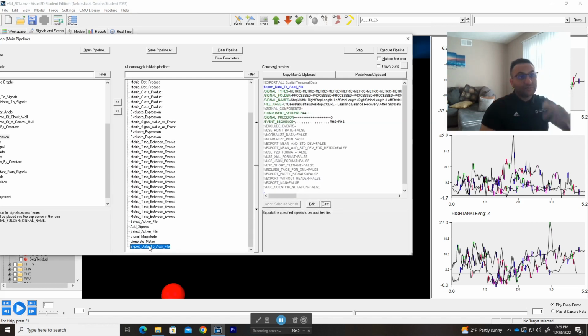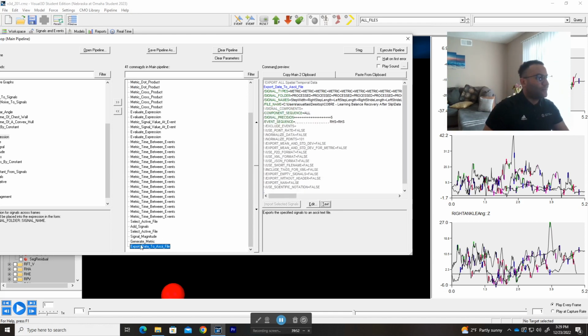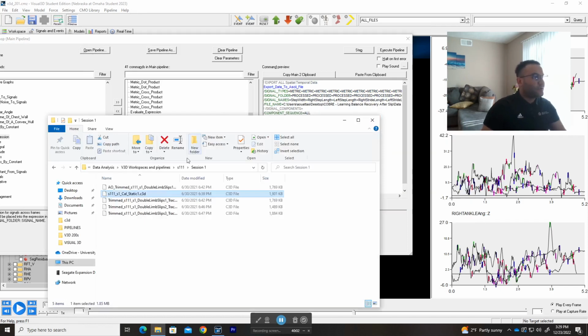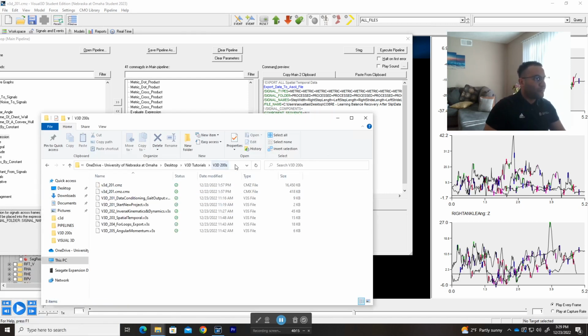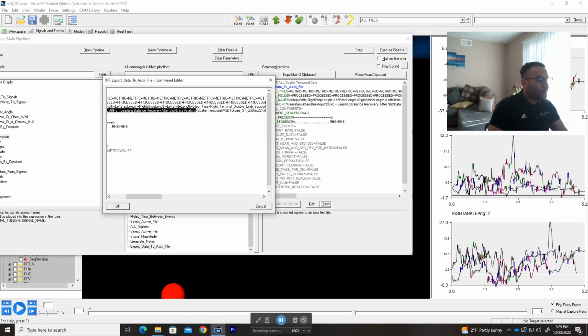Yeah, so let me go here, but it actually did process everything else. Alright, so this should be fine.